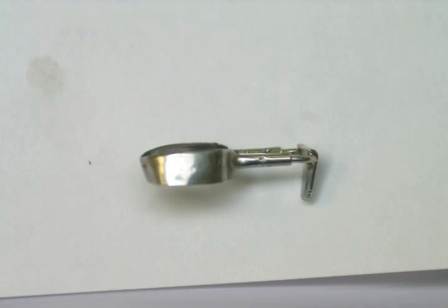To prevent this future difficult orthodontic situation from occurring, a space maintainer is placed to prevent the first molar from moving any further forward. This photo is of the special space maintainer used in this situation called a distal shoe. It looks somewhat like a shoe, and the narrow part goes next to the permanent molar, and the band fits around the tooth in front of the one removed.